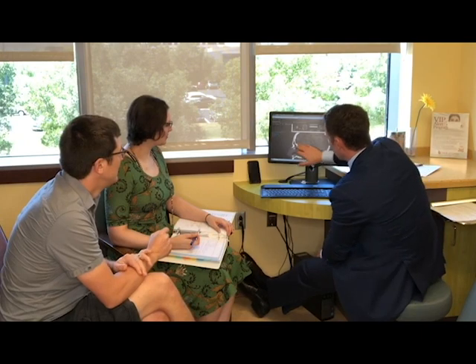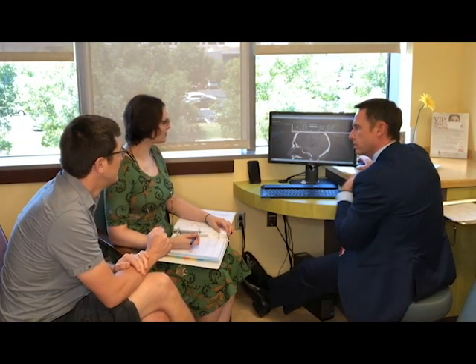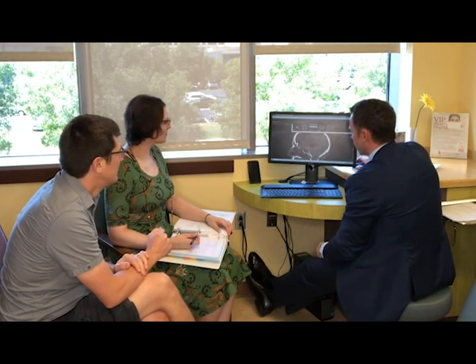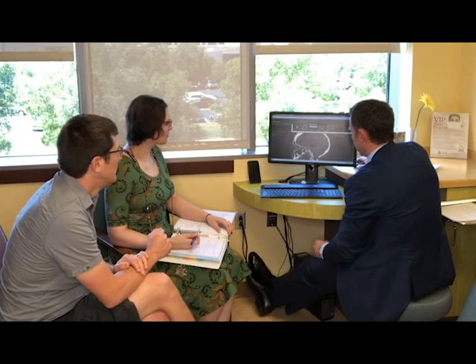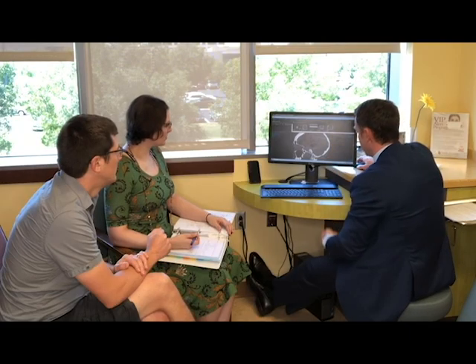Again, everything that's really black is air. So we have air-filled spaces in the skull. This is a frontal sinus. This is another sinus. And I'm going to come out to that affected side here on the left. So now we're kind of out here now.